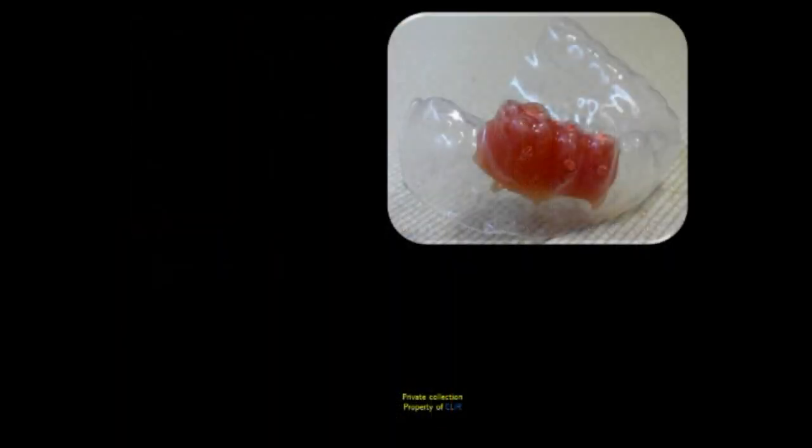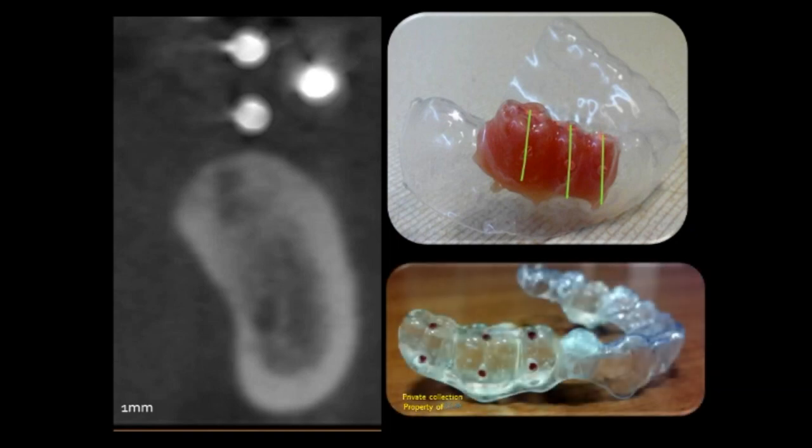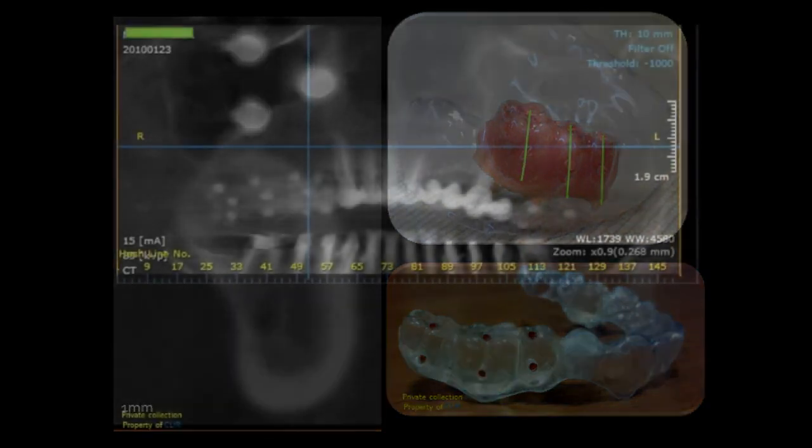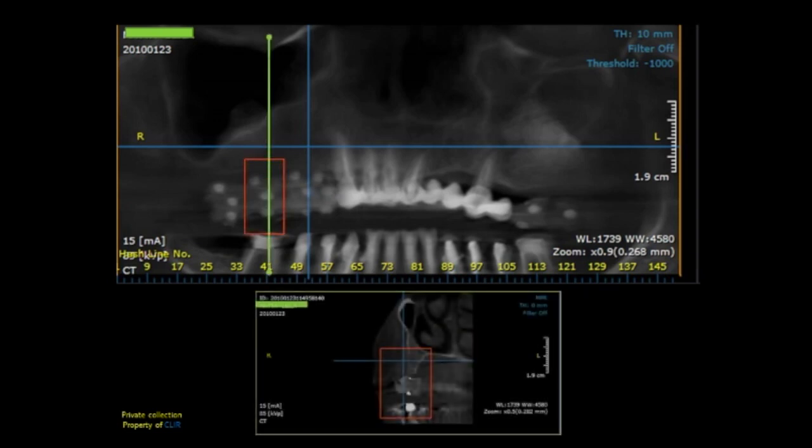Dear colleagues, in order to succeed in our planning, the 3 gutta percha points must be on the same axis. This is how we can see them on a 1 mm cross-sectional cut. This is why nowadays we are using transparent orthodontic resin. As you can see in this X-ray, the 3 points are not on the same axis and we cannot see them on one cut.